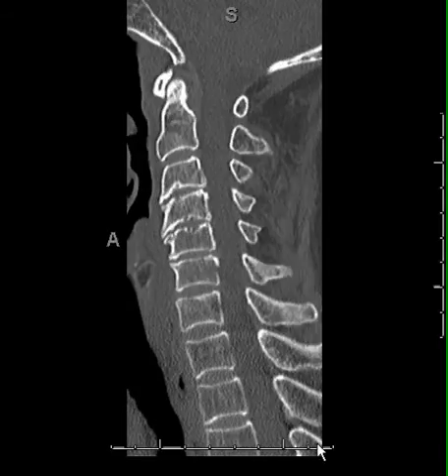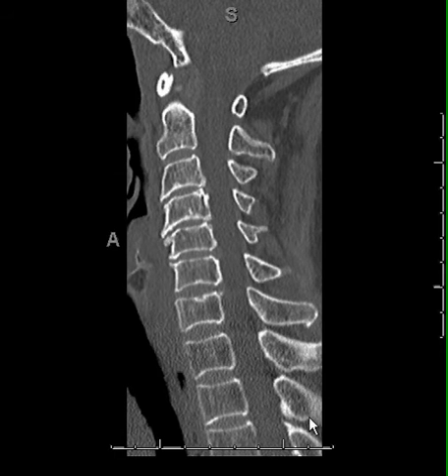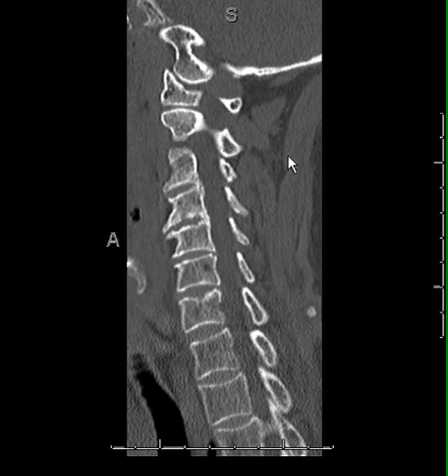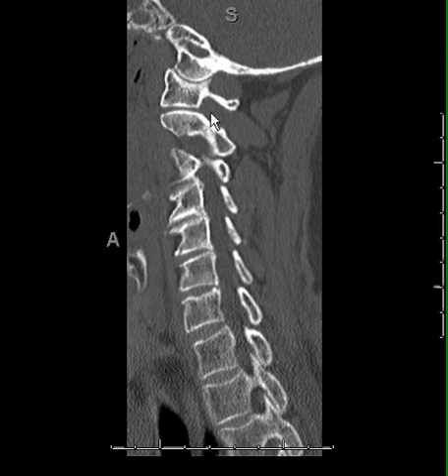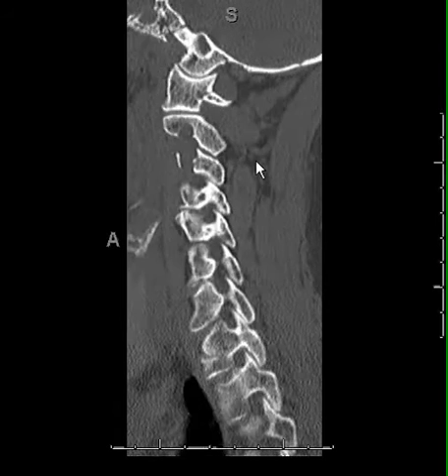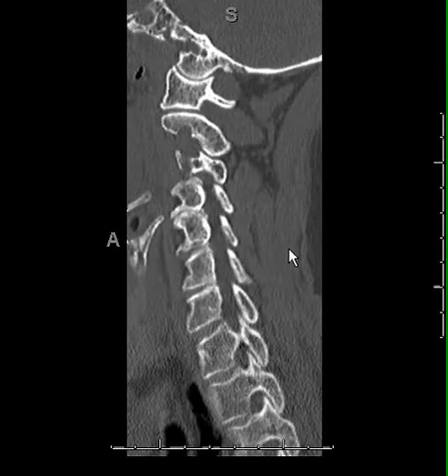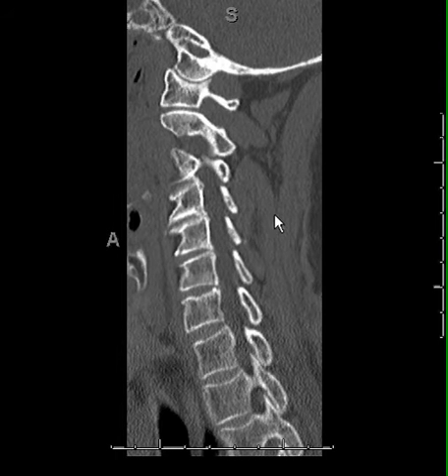Looking at the spinous processes and lamina as I go across the midline, everything looks okay. No major abnormalities of alignment, no fracture. Continuing over to the other side, I look at C0, C1, C1, C2, and again scrolling through all the facet joints. And sometimes you've got to go back and forth to make sure that you can see them all, but I definitely go down in order to make sure that I've seen everything.